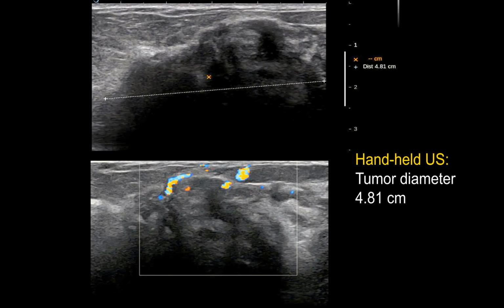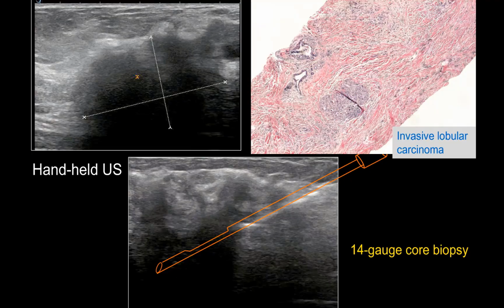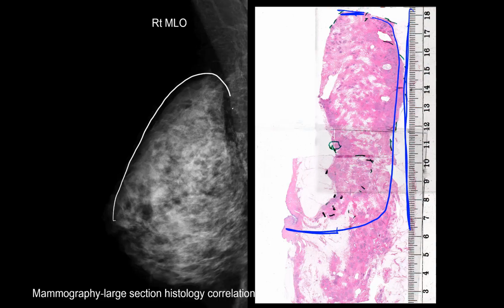And you put the needle in, handheld ultrasound, obviously carcinoma, obviously invasive carcinoma. And here is the histopathology. Look at the mark of the pathologist. Goes down, down, down to the nipple. How many centimeters? At least 10. Dear colleagues, all this is carcinoma. And I see nothing.